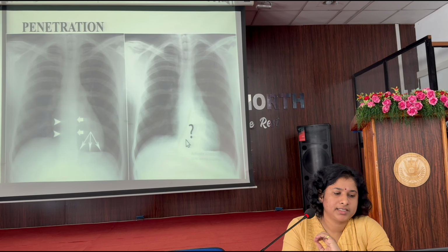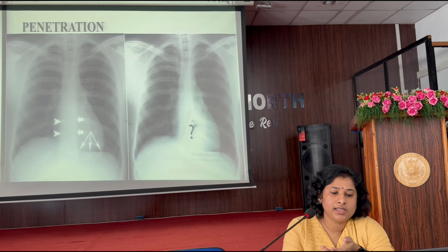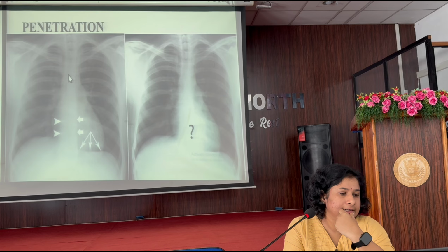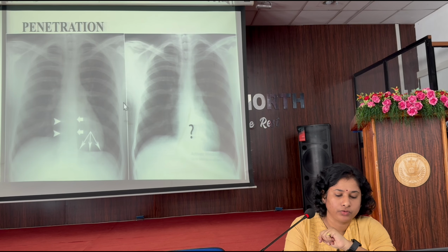So what would be the disadvantage? If there are any lytic lesions in that area, or any retrocardiac masses, they can easily be missed. In that case, ask them to repeat the X-ray. We should be able to see the vertebrae up to the T4 level very clearly in the upper thorax, and vaguely below that. So that is the quality check we have to go through.